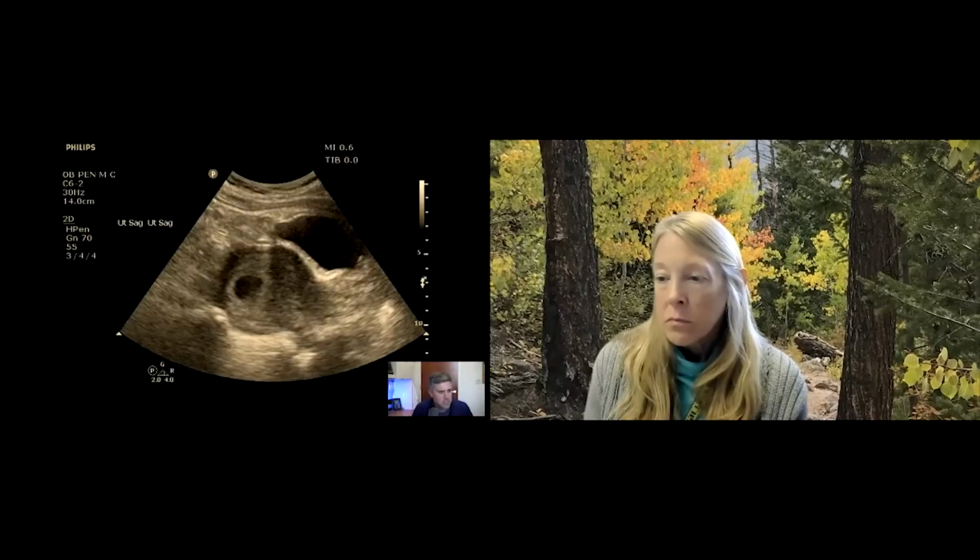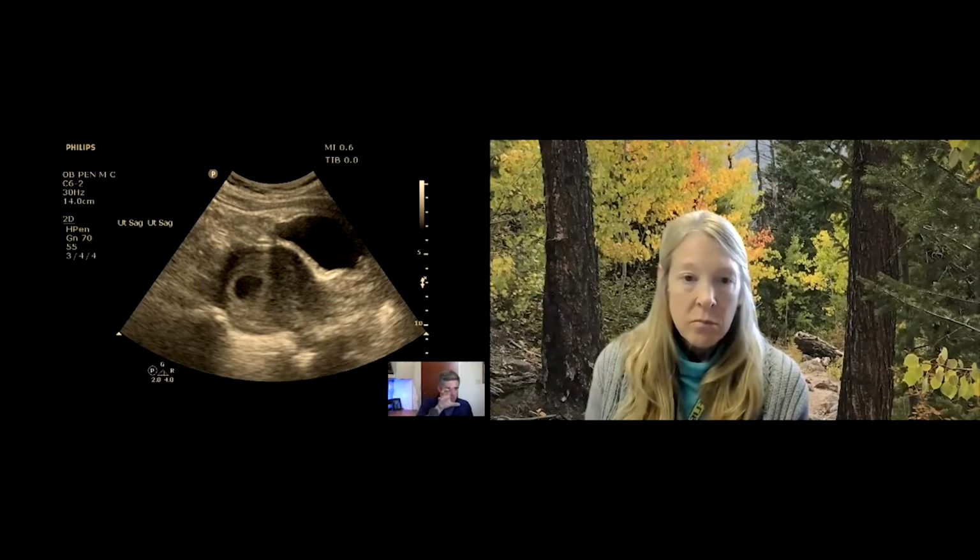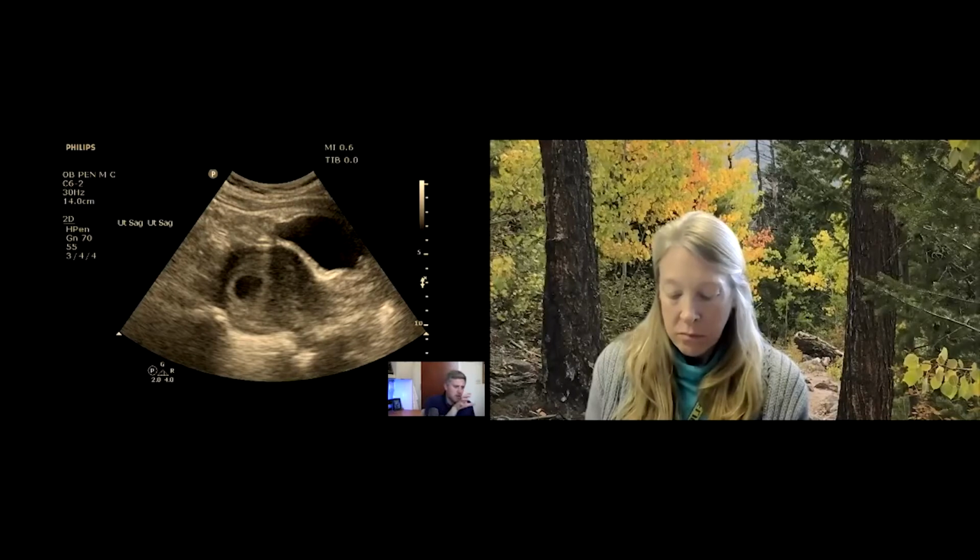And so if we switch to the sonographic view, I don't really see the pubic symphysis that well in this image. It's kind of cut off. It would be on the right-hand side of the screen. And you can definitely see the bladder on the right-hand side of the sector there. And just to the middle or to the left of that is going to be the uterus, right? And you see, obviously, there's a gestational sac in this one. So this is an example from a pregnant patient, but it's what you're going to see. You'll see that pubic symphysis followed by the bladder as you go deep, and then the uterus just deep to that, for the female anatomy, right?